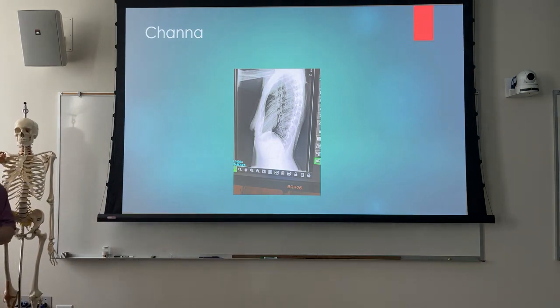So do we repeat that one? I don't know. I don't know the patient's history. I don't know what we're looking for specifically on that one. So can we see what we need to see? And if the answer is yes, then why go back and blast the patient a second time, right? So again, you might check with somebody, depending on the patient's condition, say, do I need to repeat this? Even a radiologist.